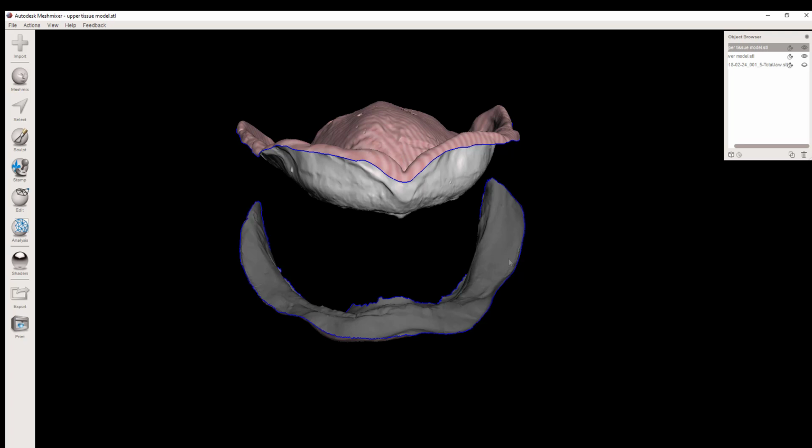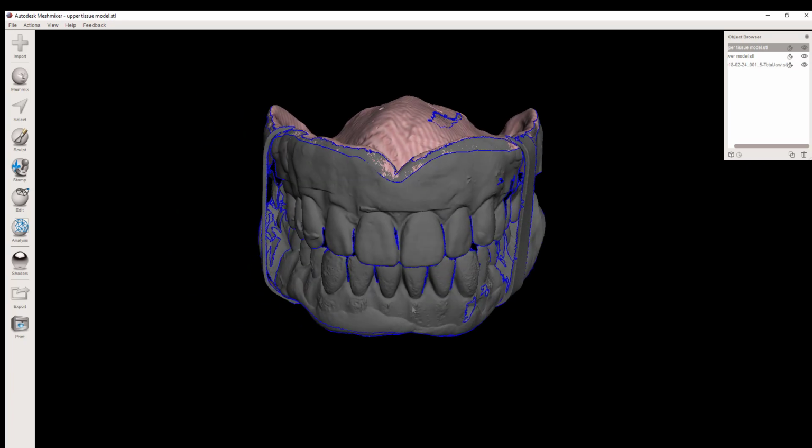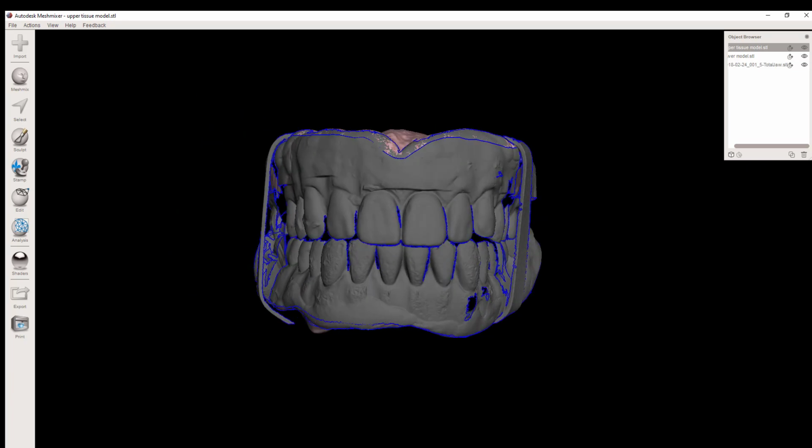The patient had acceptable dentures as far as aesthetics and the VDO. The fit was just a little poor. So what we opted to do is use his current dentures as impression trays and then do reline impressions inside of that. And then by scanning in both of those denture impressions and rubber banding them together and scanning in a buccal bite, that's how we achieved all of our models and got them into the correct orientation.